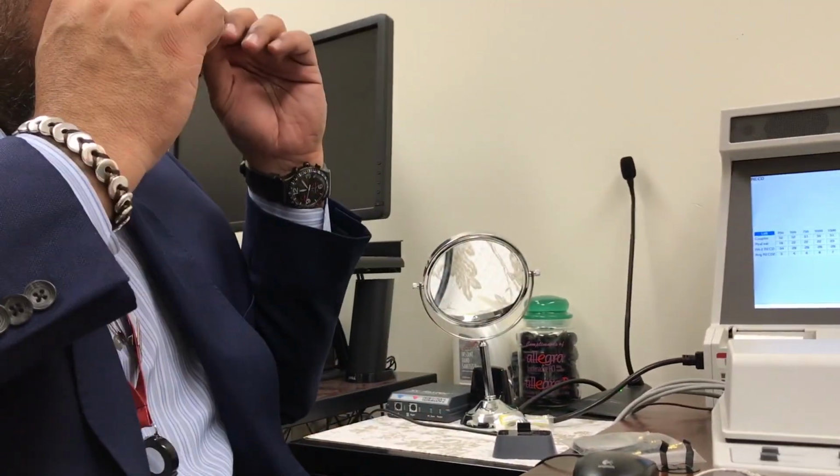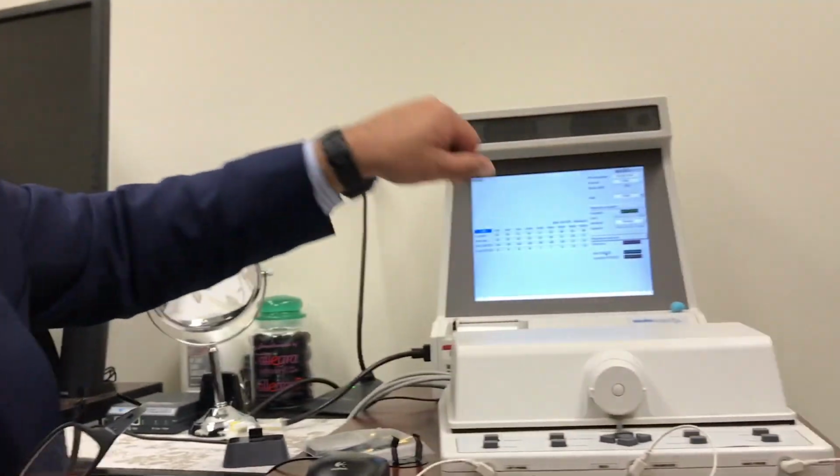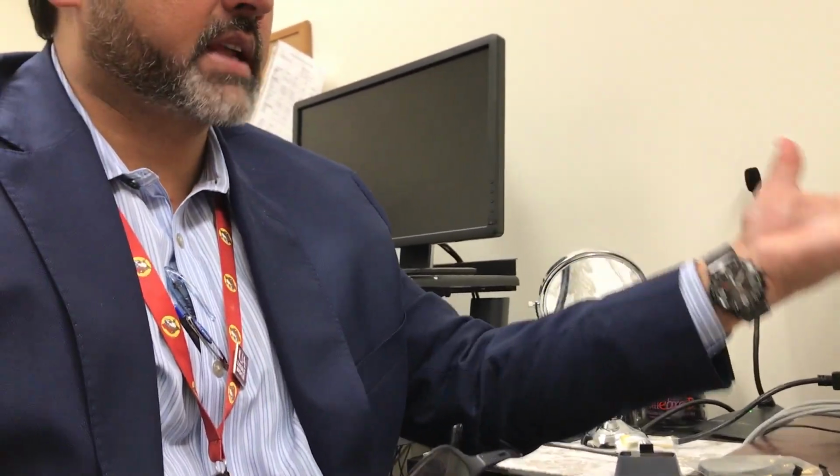But basically, that's your lab, and then what you're going to do is you're going to tell me if the number's negative, you're going to increase gain. If the number's positive, you're going to reduce gain, and that's going to happen with your prescriptive formula. So this is another correction factor. Okay, and that's it. If you see kiddos, you have to do the RECD.